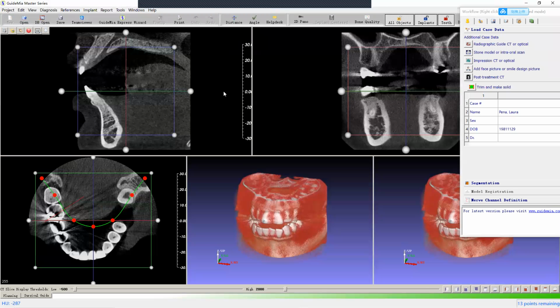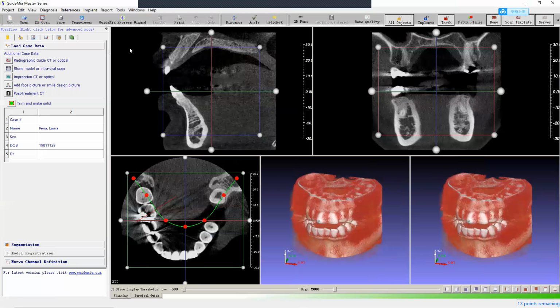So the first thing is to click on a new project, correct? Yes. Okay, so that's the first tab on the upper left-hand side, if I remember where it was located. And so we have all of the DICOM files saved in a folder, and DICOM and STL files saved in a separate folder? Actually, you better put them in the same folder. Put them in the same folder, okay. Yeah. So now we open the DICOM files.